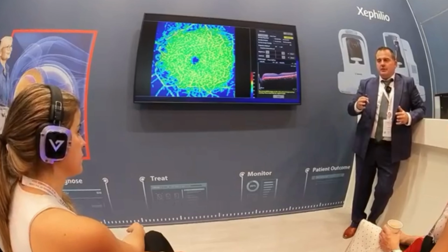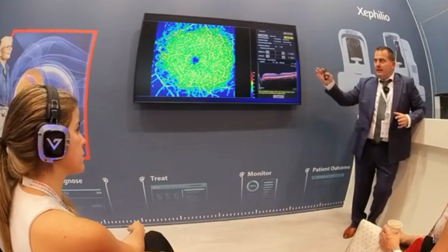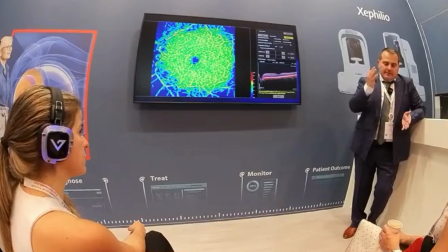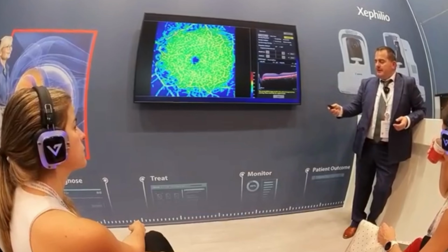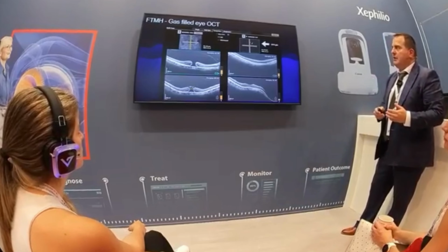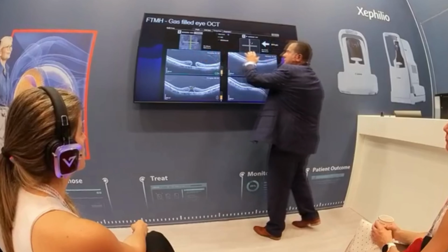What is OCTA imaging? OCTA imaging is tissue subtraction from high density 3D scans. So the more density you have in the en-face scan, the better the image data will be, and it will provide us with better diagnostic abilities. This is something amazing here. You can compare this fundus and this fundus.